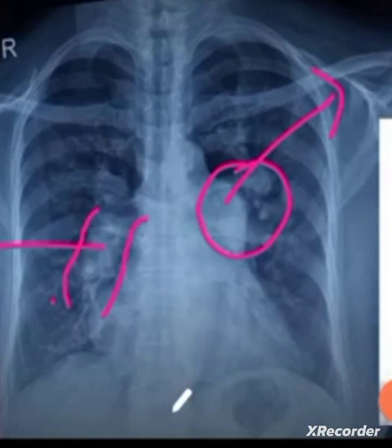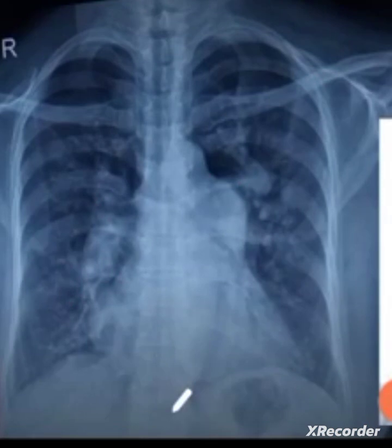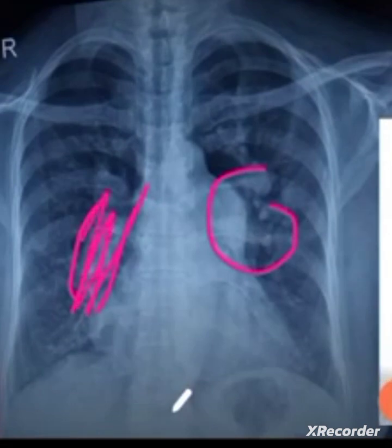So the pulmonary bay sign is a very important sign. You can miss this, but you should not miss this. This is a prominent pulmonary artery. We know that in the right hilum we have arteries, veins, nerves, and lymph nodes. But when you see the pulmonary bay sign along with a bulky right hilum, this is actually the descending pulmonary artery.